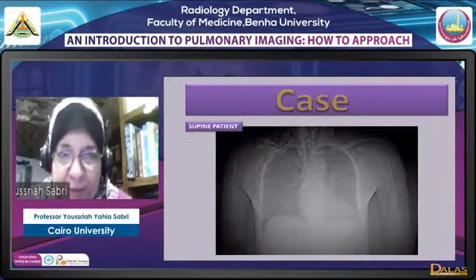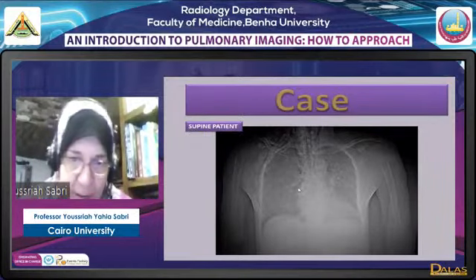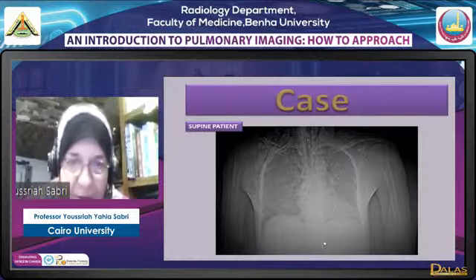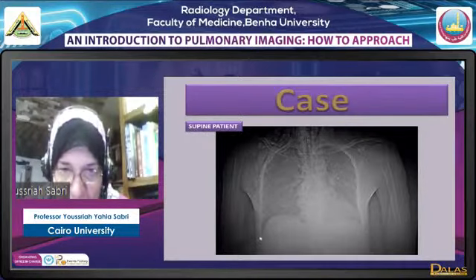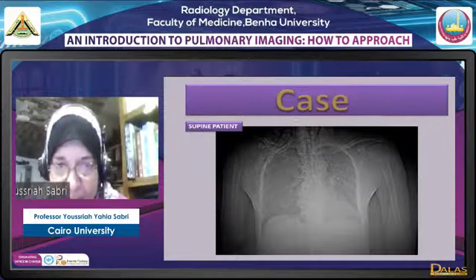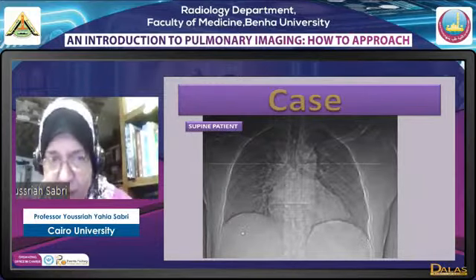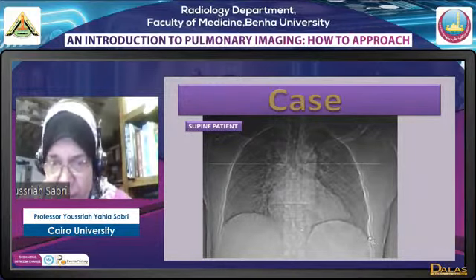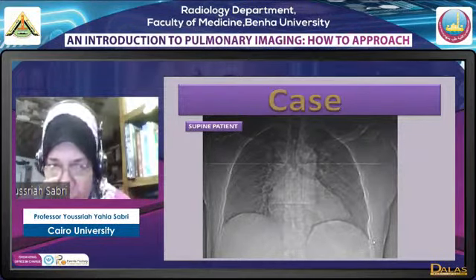Now this is another supine patient. This is a film paper, of course, the image is from a paper, that's why it's not very nice. This is a normal costophrenic angle. This is the deep sulcus sign, and the patient also has surgical emphysema, as you see here. Another supine patient, and here the lesion is, this is the normal. This is the deep sulcus sign, and it's seen on both medial and lateral sides.